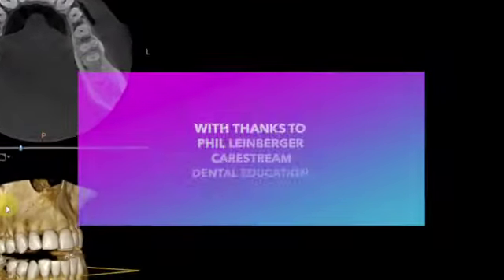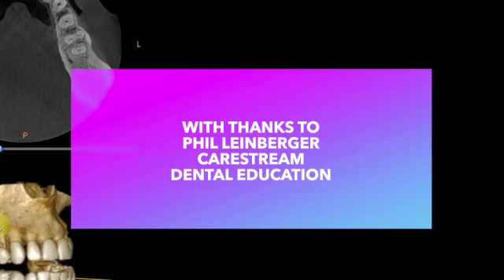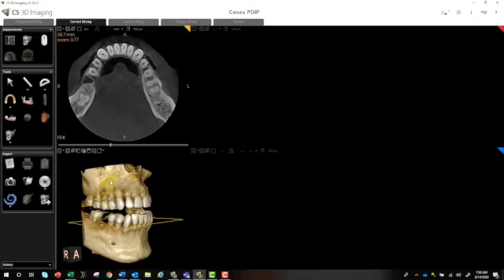Hey everybody, this is Phil, and this tutorial will cover creating your panoramic curve and mapping your nerve. So first and foremost, we want to map our panoramic curve.